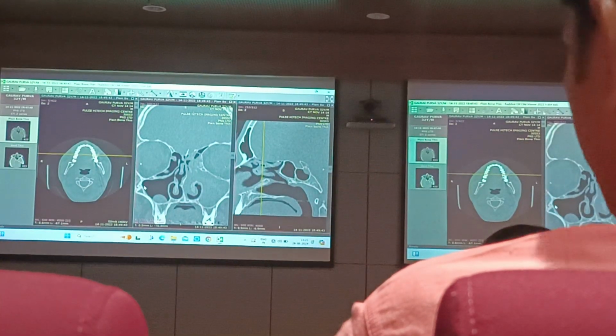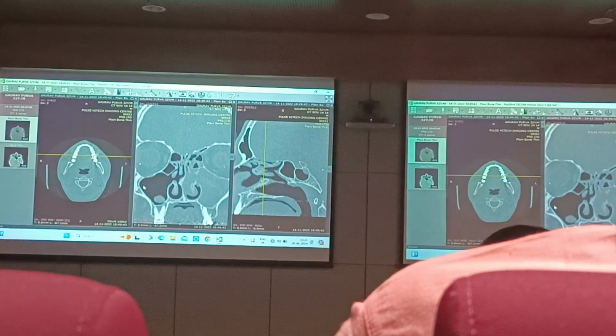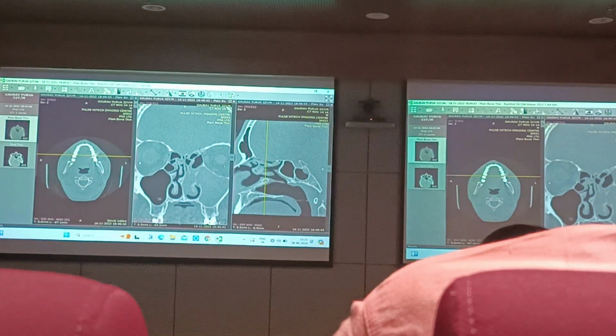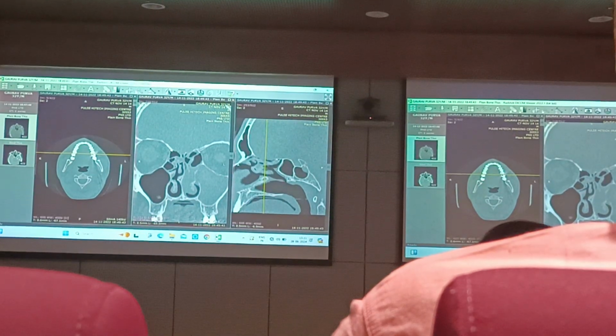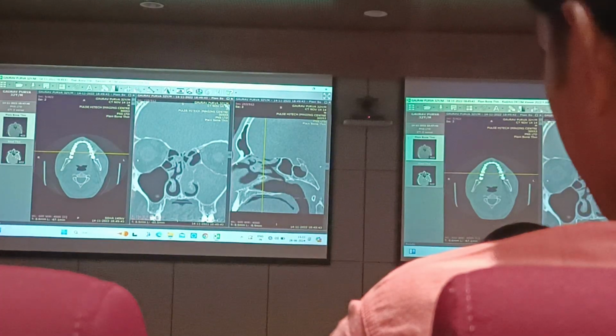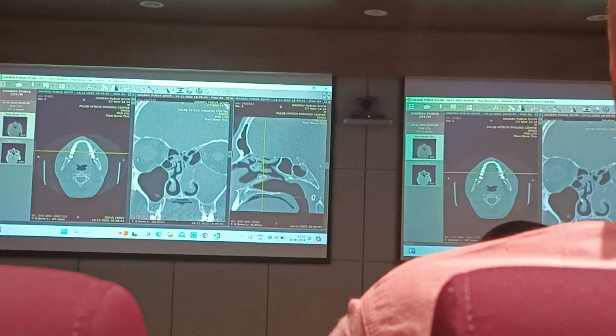Yes. Okay, if you go further on this again, you see this is the posterior ethmoidal cells. Can you see? It's become oval. Yeah, this is becoming almost triangular, where this is becoming oval. What this becomes? Posterior. And this remains the flat area which I told you about, the fovea. Okay, that's the posterior. There is some amount of haziness all over here.